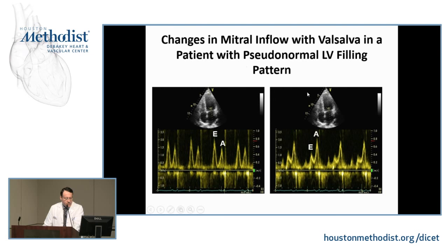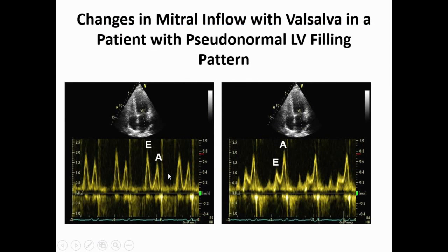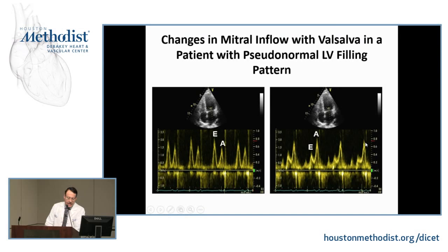Then there is the mitral inflow, looking at what happens to it with Valsalva. During the straining phase, venous return drops, left atrial pressure drops, the transmitral pressure gradient falls, and you end up with a low E, high A. So why did it change? Because the LAP is up, and that got unmasked by Valsalva. The challenge with the Valsalva is getting a patient who is cooperative enough and the ability to standardize the effort, and as a result, its sensitivity may not be that high, but its specificity, if properly executed, is pretty good.